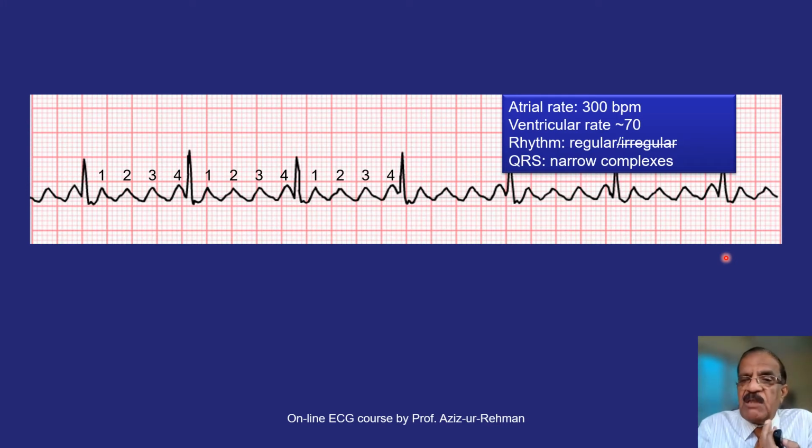If you examine this patient's pulse, you would pass it as absolutely normal, and you can never tell that this patient has got atrial flutter. So you can only determine atrial flutter on ECG. Now, of course, we do not do ECG on every patient. The patient would have symptoms of palpitation, history of syncope, or patient already has a known case of flutter. So that is why we do ECG. So this diagnosis is only possible on ECG.